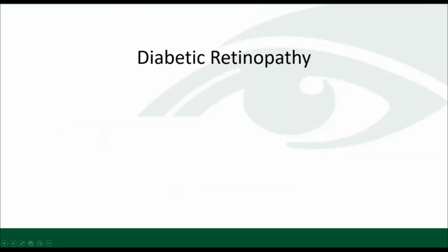So the one thing that I think OCT has been able to do is really allow us to look at the retina three-dimensionally, to be able to see and recognize when patients have retinal thickening. Before the OCT, it was really relying on your three-dimensional abilities with a 90 or a 78 or even a contact lens and recognizing if there's retinal thickening and if that retinal thickening was clinically significant.